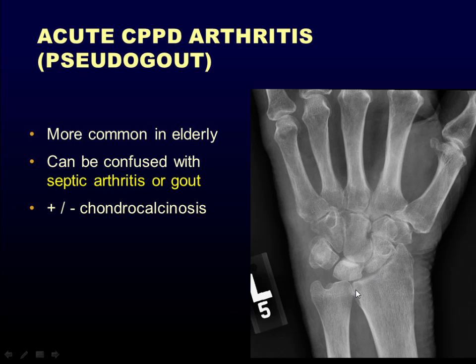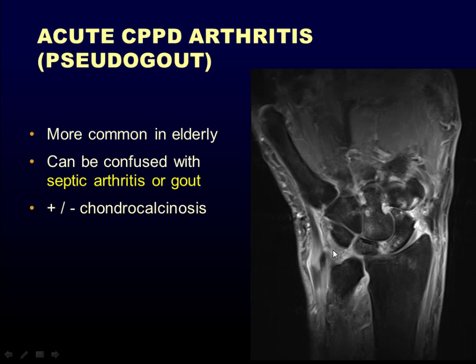Where here we're seeing erosive changes and marked joint space loss, the synovitis, inflammatory changes, and erosions all associated with it. And a lot of times we'll have to aspirate in order to make sure that this isn't some septic arthritis that's spreading from the distal radial ulnar joint, radiocarpal joint, midcarpal row.